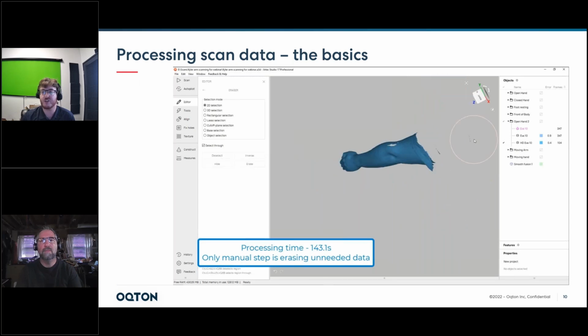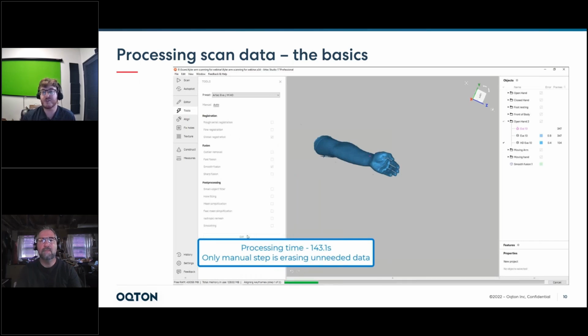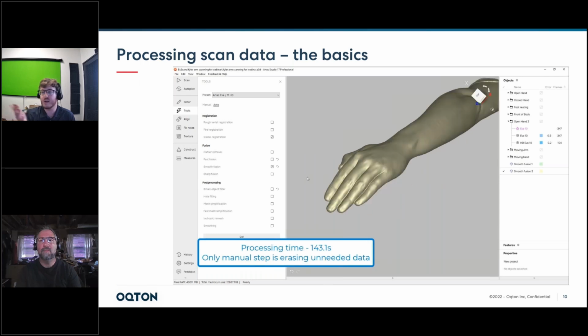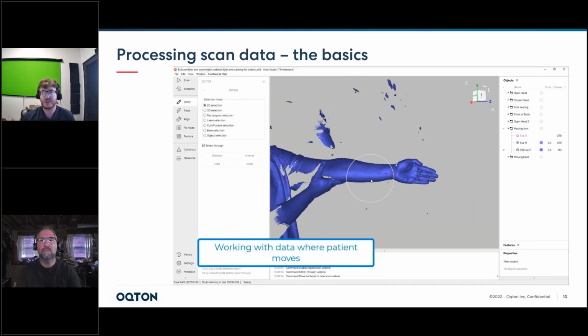This is using a little higher quality data than the first scan, but we're still going to do that global registration. We're still going to do that fusion to create the mold. And here's where we get a little dip into the first set of automation. We know the processes we want to run, so we have an auto mode to just say, run those 2 or 3 steps sequentially, and we can step away. No need to manually click anything, and we create our mold again. And we can just keep repeating this process for different scans.